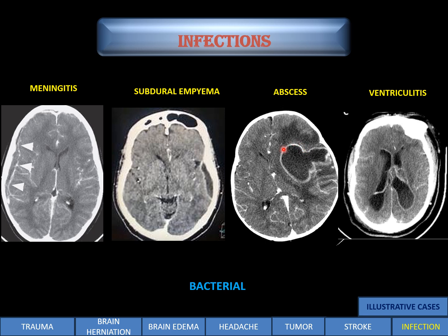Abscess, in which there is a cystic lesion with peripheral enhancement, which is seen here, and there is an extension and compression of the adjacent left frontal lobe and temporal lobe. Ventriculitis: the normal ventricle will not show any enhancement. If the ependymal layer of the ventricle is showing enhancement, that is called ventriculitis.